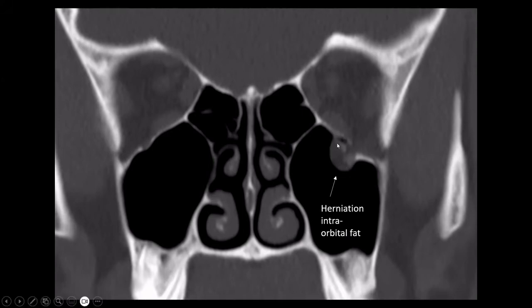We also see that the fracture is located at the level of the infraorbital canal, and orbital floor fractures often go through the infraorbital canal. Nevertheless, patients can have transient sensory deficits in the territory of the infraorbital nerve, but these are generally transient. I'm not saying there are no exceptions, but in most cases, this does not lead to permanent sensory deficits or disturbances.